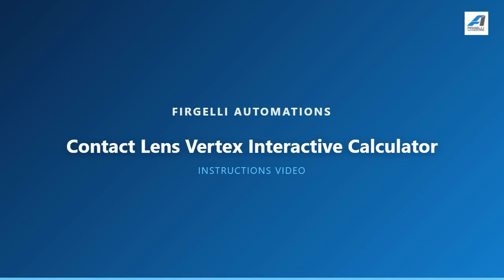Welcome to the instructions video for the contact lens vertex interactive calculator. This calculator helps you convert spectacle lens prescriptions to contact lens prescriptions by accounting for the vertex distance, which is the gap between your glasses and your eyes. This adjustment is essential for accurate vision correction, especially with stronger prescriptions.